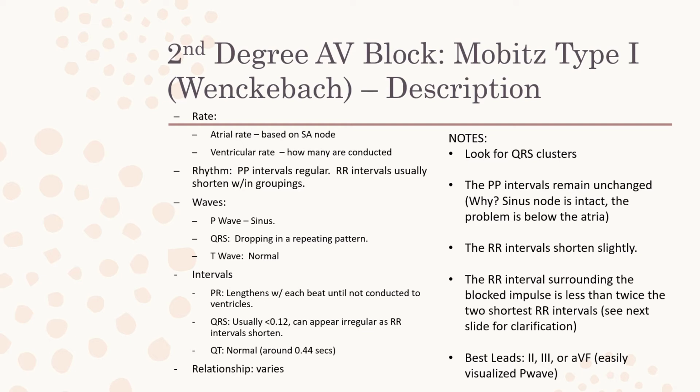The key is the P to P intervals are regular. That's what's going to tell you that you don't have a non-conducted PAC here. The P to P intervals are regular. The R to R intervals usually shorten within the groupings.